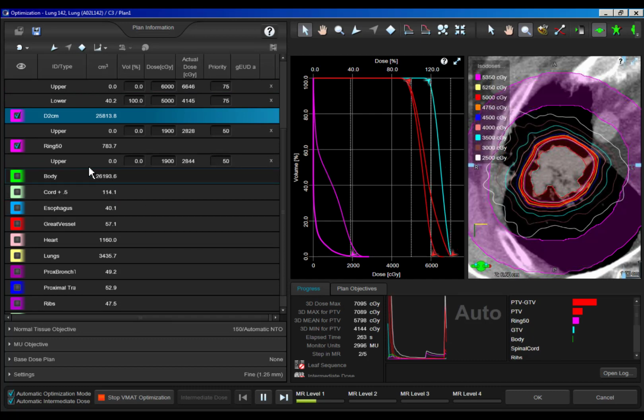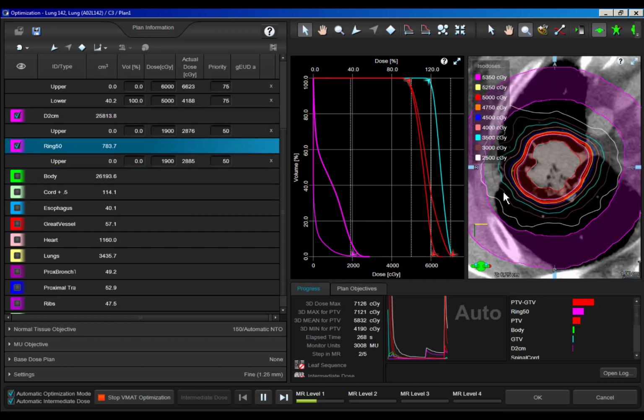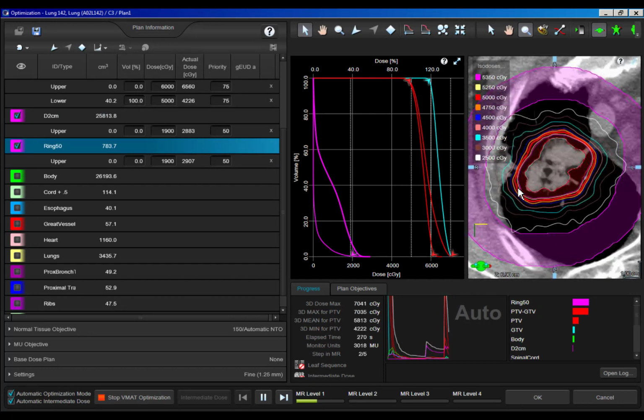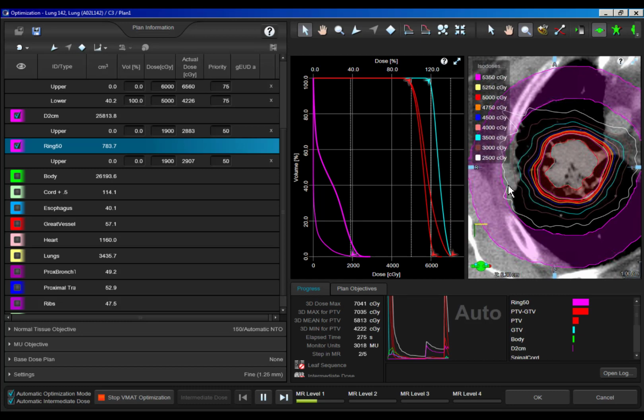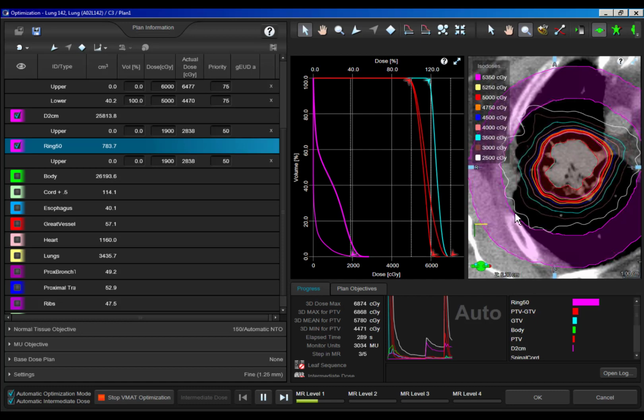And then we're specifically going to focus on the dose 2cm away with this ring, because that is one of the objectives, the most strict objective. So we'll go over this again once this plan finishes up, but our conformity objectives and the dose 2cm away depend on the size of this PTV. But the most strict objective is you want your 50% line to be inside 2cm. So that's what I'm trying to always do.